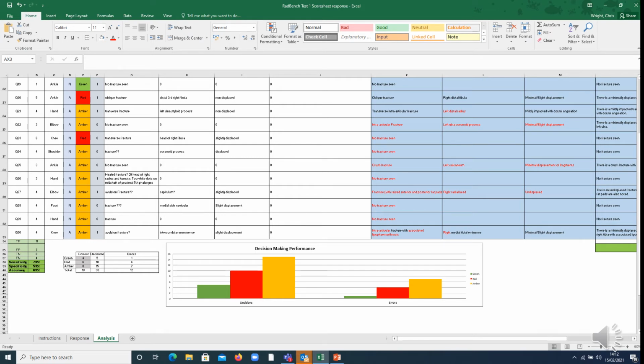So down towards the bottom of the sheet here, on the bottom left, you can see here's the sensitivity, the specificity and accuracy. You can also have the NPV and the PPV if you so wish. Again, they're just some more hidden cells that I haven't shown on this particular case. So that allows you, the student and yourself, to know what the performance of the student is in terms of sensitivity, specificity and accuracy.